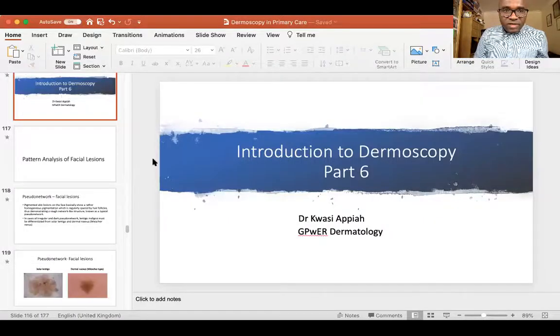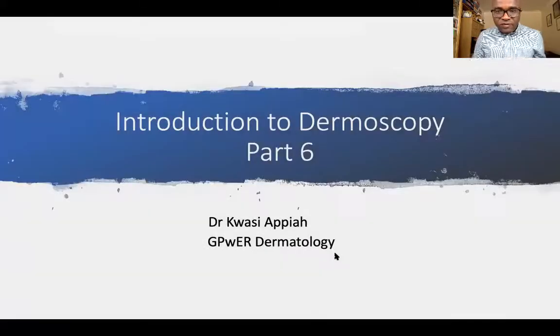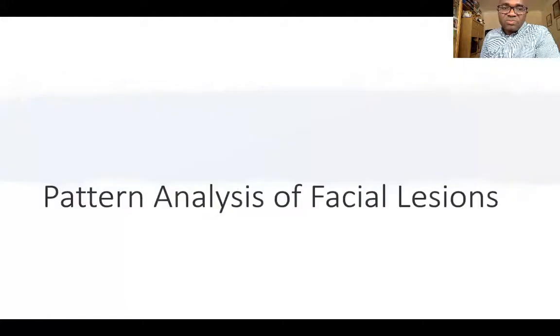So part 6 of this series is going to be focused much more on where we had left off from the last session, and this is pattern analysis as part of local features and global features, and we are going to concentrate on pattern analysis on facial lesions.